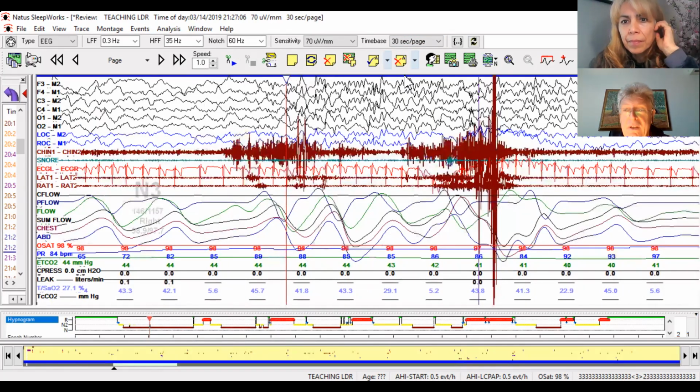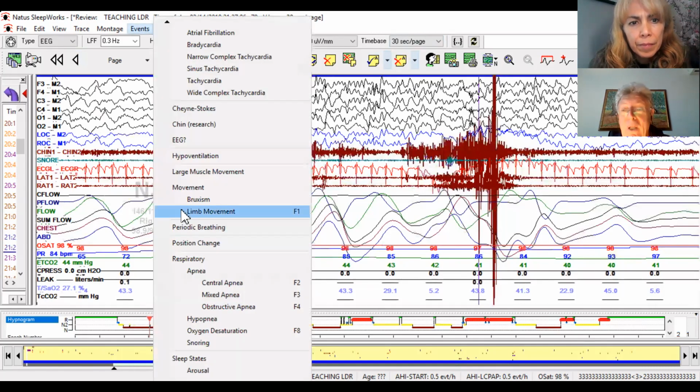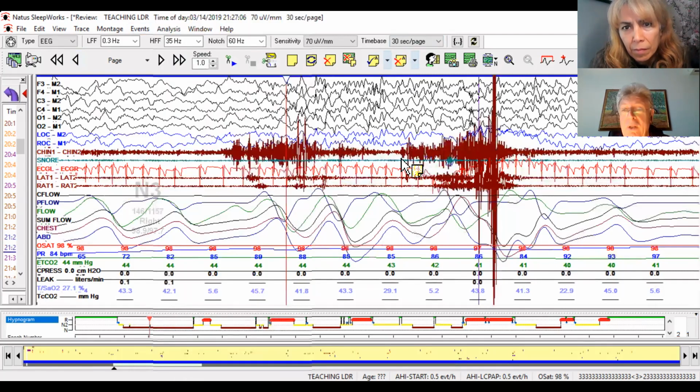But if you put in 30 seconds, you see that there is indeed a separation, because as you can see, in between those two movements, there is a return to the baseline, and that is a return below the double the baseline for more than 1 second.